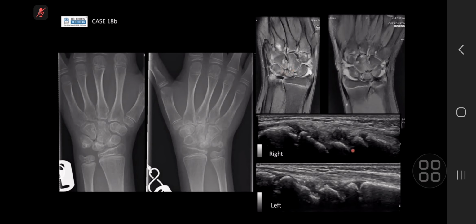Now, on ultrasound, this is your classic view of the radiocarpal joint in the midline of your wrist, and the black bit shows synovial thickening. The only bit that I didn't give you was the Doppler, which would show vascularity, suggesting active synovitis. In arthritis in a child, if you've just had treatment, you can have a lack of Doppler vascularity, but you still have synovial thickening persisting for a bit until the treatment starts to kick in. But you can notice that the right side is a lot worse than the left, which corresponds with what the patient's symptoms are.